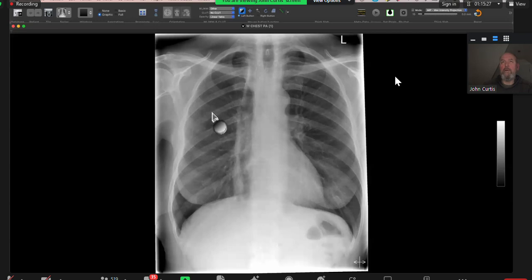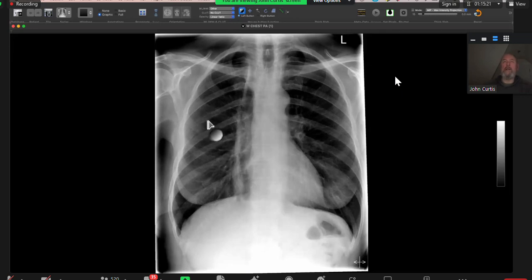Looking at the sixth rib on the lateral margin, it looks like a lytic. It's not lytic. What else could it be? So it's got to be sclerotic. I can't see any rib notching. There's a soft tissue density actually overlying the... Well, hang on a second.